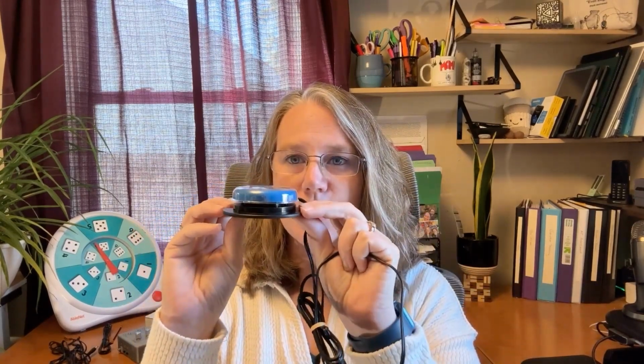We're going to take a look at some different types of switches today so that you can see what they are and what they do. One example of a switch is this simple one. This is considered a jelly bean switch. As you can tell, it has a small base. It has some holes on the bottom, so these can be anchored to a surface.